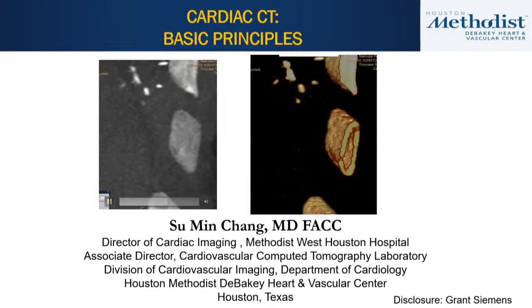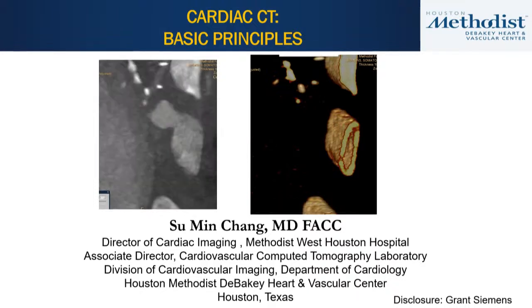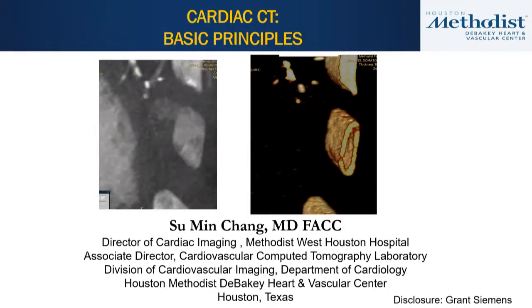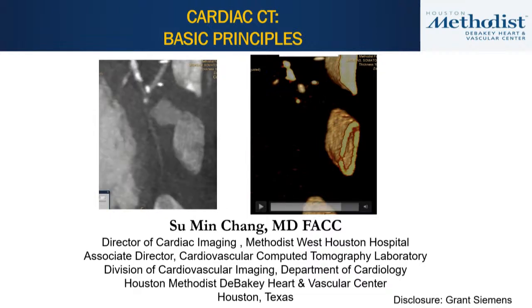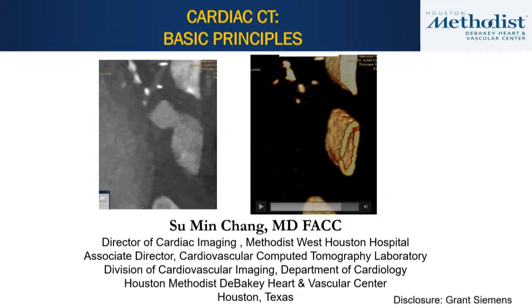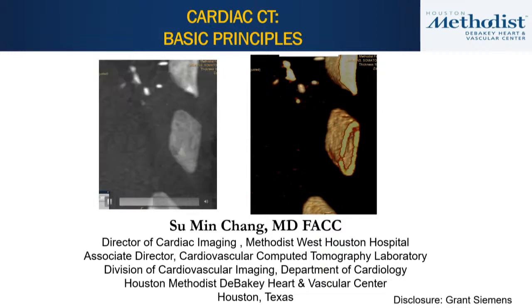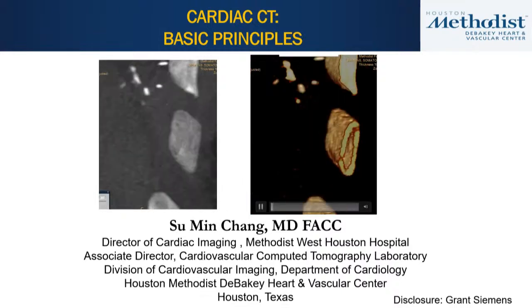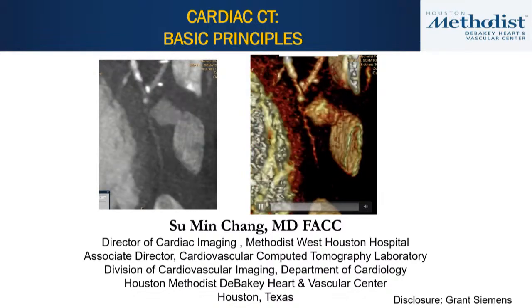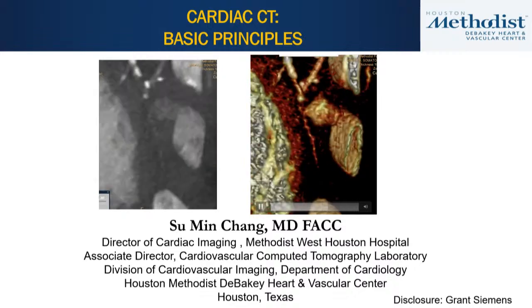So someone tell me what's the problem with this patient? So this is a cardiac CT, and here we diagnose a patient with rupture of the distal LAD after the LIMA graft. This is the 4D images. So we're going to talk about how do we get to an image like this to help the patient.